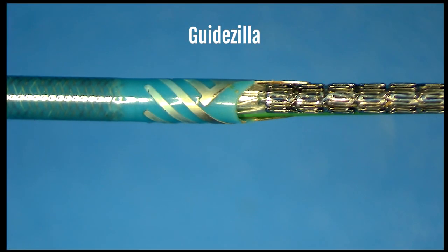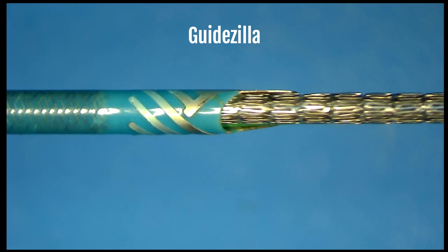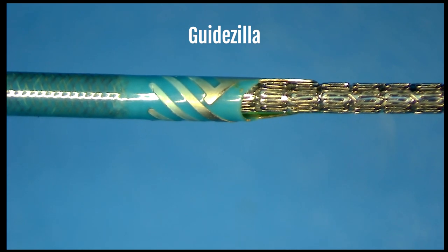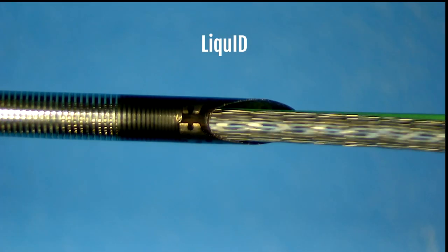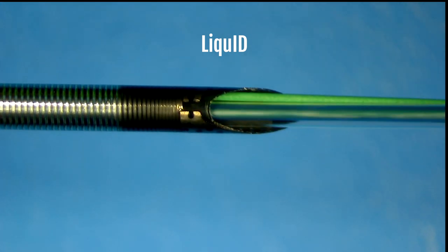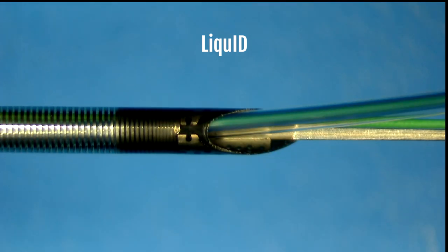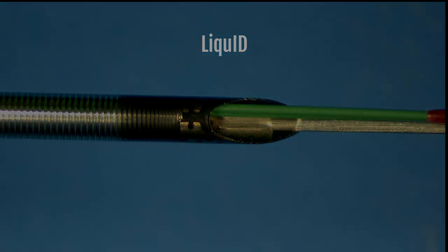To further illustrate compatibility, we have some videos here of a 3.5 Megatron stent and a buddy wire. Here you see the Megatron stent passing through the collar of the Guidezilla. However, as the stent travels further into the distal shaft of the device, friction seems to build within the system and the stent gets stuck. In comparison, using the 6 French LiquID, the exact same stent and buddy wire, you can see the stent sliding in and out through the distal segment with ease. This is because of the 061 size of the distal shaft. In simple terms, it fits.